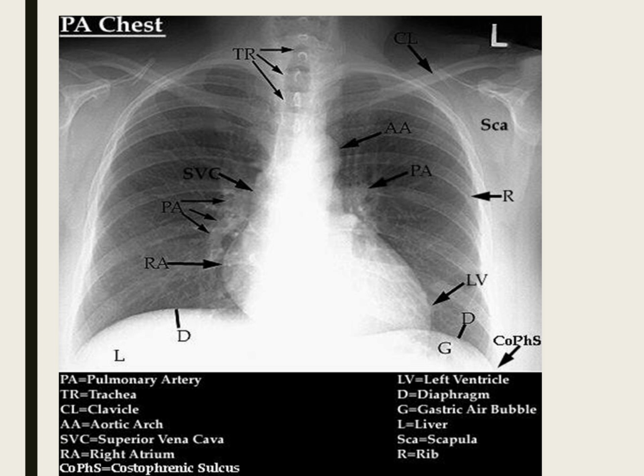Sometimes you can see a fissure. I don't see any fissures on these X-rays. But I look for consolidations around the diaphragms, the edges, and around the cardiac silhouette. If you lose the edge of the right atrium, same thing, something's going on there. If you're losing the edge here, it could be retrocardiac; you should mostly be able to see through the heart and pick up the ribs.